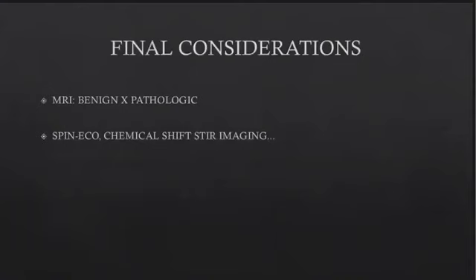This data suggests that pathological fractures of vertebral bodies may be differentiated from benign processes with MRI. Therefore, in a difficult clinical problem, although bone marrow biopsy remains a realistic option, MRI may be helpful in the differentiation of benign and metastatic compression fractures through the use of different techniques and sequences.